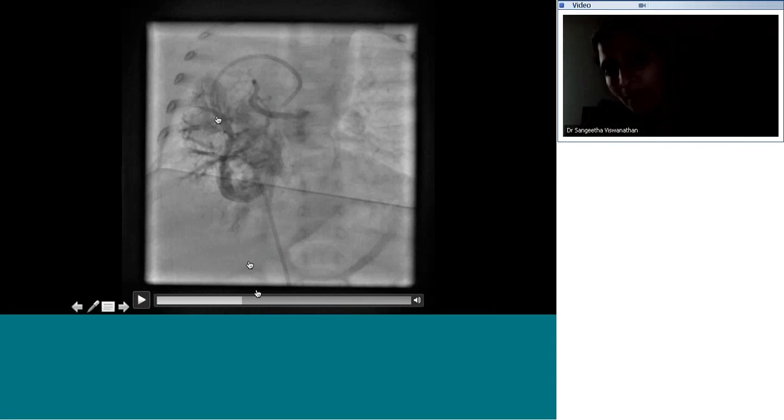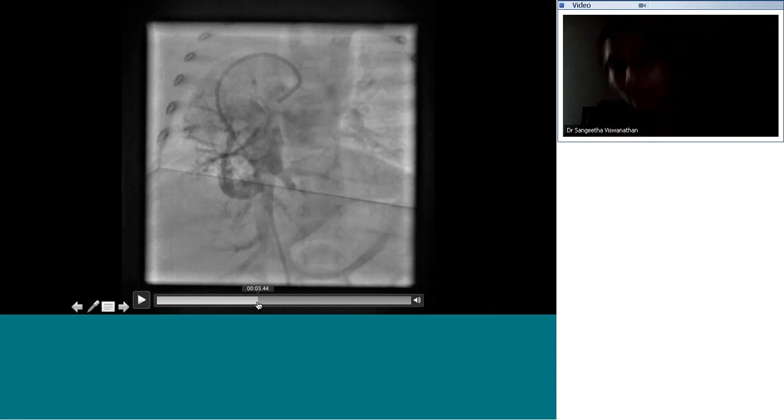But if you look here, which is the right lower vein, you keep following them. You see, they form a pulmonary venous channel which enters the IVC. So this catheter is actually in the IVC, RA, RV, and it has come into the RPA. So this is a very nice example of the Scimitar syndrome.